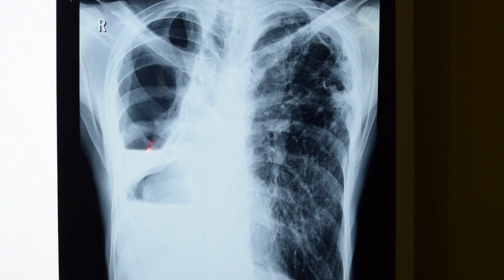This is the second hydropneumothorax. This is a large air containing space, and below it there is a level and some element of effusion. So this small air fluid level can be a lung abscess. So in this overall scenario, this is a right side destroyed lung as compared to this left one, and this is post-TB sequelae. In this patient we have to rule out first of all MDR.